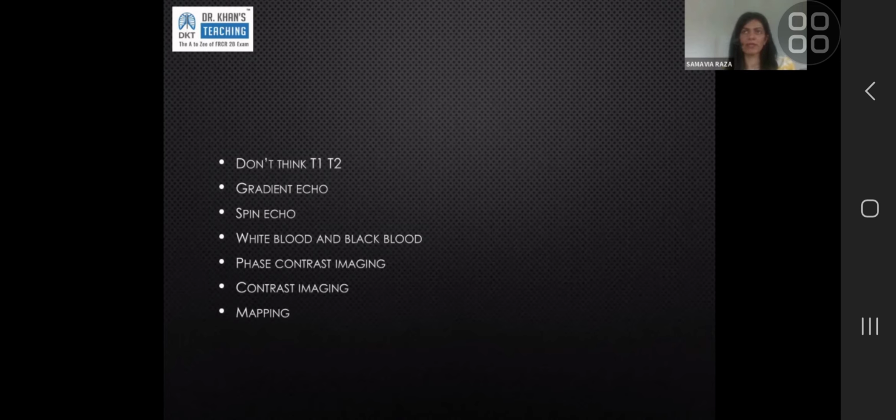So it's like doing a virtual biopsy. It is giving you information about the morphology of tissue without giving them contrast, without doing a biopsy. It is an extremely exciting development in cardiac MR. The last year or so has really seen it take off. Not all centers do it, but it is the latest development.